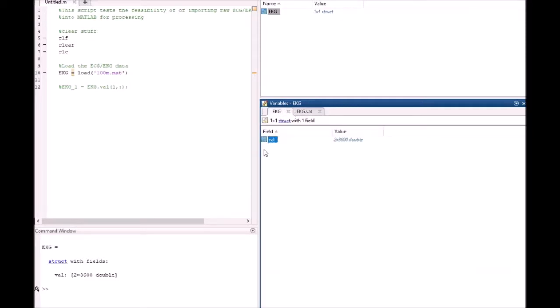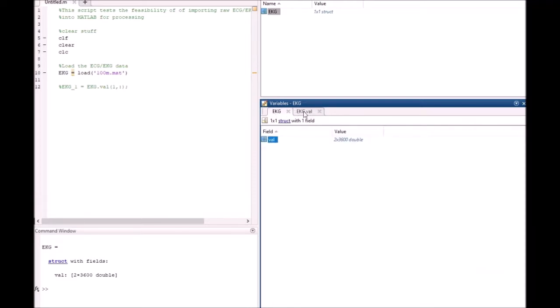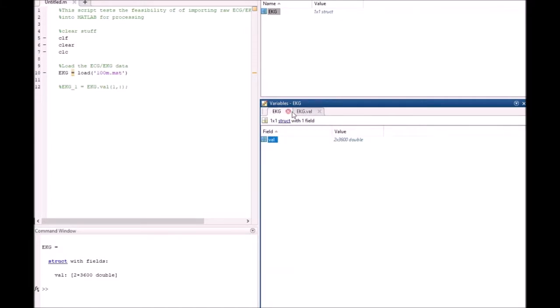So you have val, and then TS is timestamp, and then you have time spacing, and then frequency. Normally there'd be a frequency file in here. Since I don't see the frequency file, that's kind of frustrating because I'm wondering how much time is passing. But I have a conversion for that from when I processed this data before, so I have an idea of how big it is.